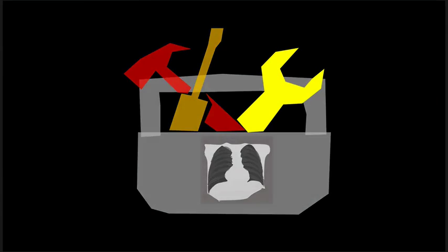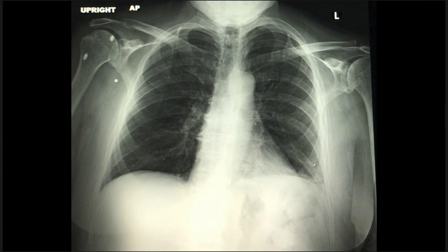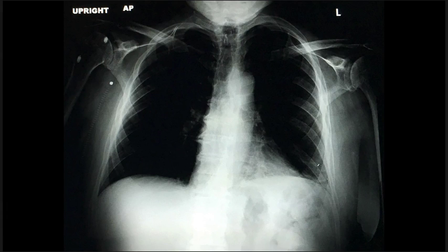All right, our last tool that we're going to talk about is the hard window. So I have a mantra every day when I get up to come in to read radiographs with regard to the chest. Every day my mantra is the same. Today I will look through the heart. So what does that mean? That means that I will do a hard window through the heart. Every time I'm interrogating a frontal radiograph, I do a hard window, like this. Every single time. I look right there and I try to look through the heart. You should be able to see through the heart.